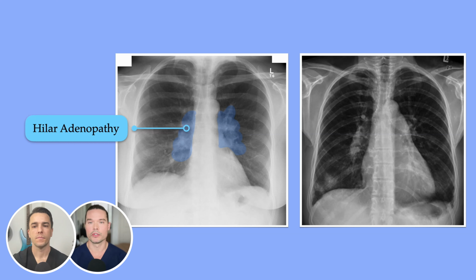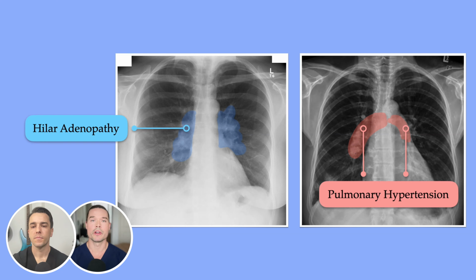The other example is an example of pulmonary artery hypertension. You can see a prominent pulmonary arterial trunk, and then those pulmonary vessels are also going to be larger and more engorged and denser. Just keep in mind, clinical context is key in these cases. We're not diagnosing pulmonary hypertension based on a chest x-ray. But if you have a morbidly obese person with obstructive sleep apnea for many years and you see this, you're like, okay, this is concerning for pulmonary hypertension.